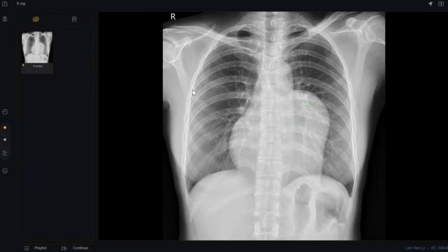There are no further lesions in both lung fields. There is no pleural effusion. The rest of the bones appear unremarkable, and the overlying bones over the mass are also unremarkable. So in summary, the findings are of an anterior mediastinal mass. My differential in this case could be lymphoma. Another possibility could be a thymoma. Teratoma is less likely as this patient is of older age, 40 years. So I will further evaluate this patient with CT chest with contrast to further characterize this lesion.